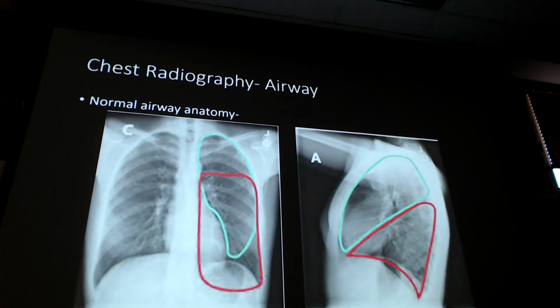So if you have a lateral, we can confirm it. Same thing with the left side. Just kind of showing you that picture again. This one's a little more clear, hemidiaphragm, right? But then that's why this says the left heart border is in the lingula of the upper lobe, so like down here, but it's still upper lobe.